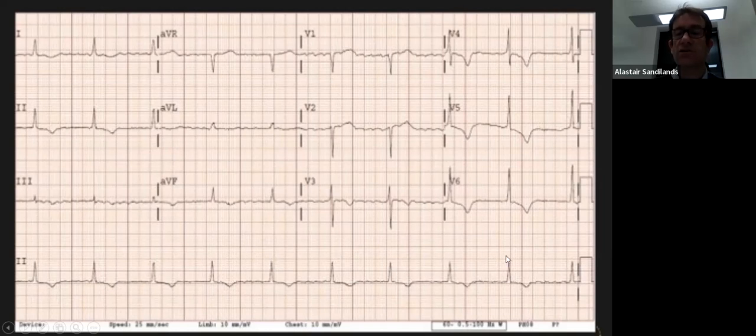So because you've got a regular rhythm, you've got atrial fibrillation occurring in the top chamber. It's not penetrating down past the AV node. And therefore, we have a regular, narrow escape rhythm in this example. Okay, the rate is 60, borderline bradycardia, but this is AF with complete heart block with a narrow escape rhythm.